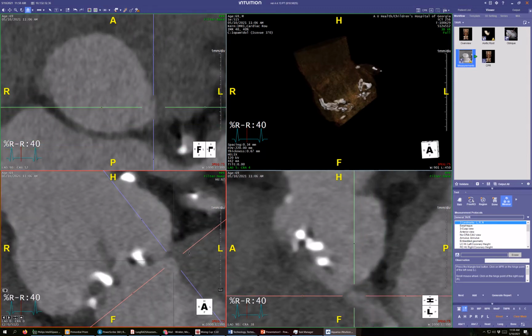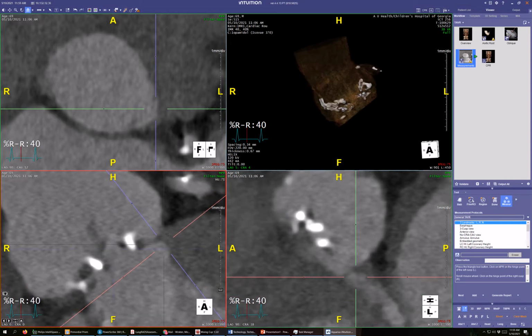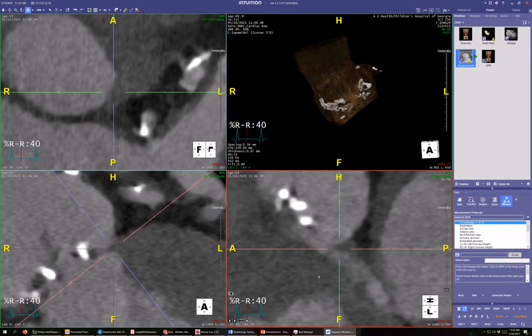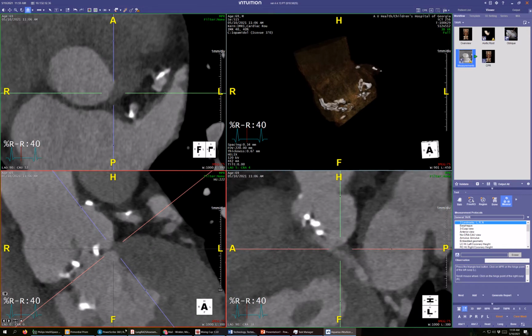I think that's a fake out. I'm just translating through the pseudocoronal. It's there, isn't it, Hanping? Wouldn't you agree? Right there. Okay, so that's one.